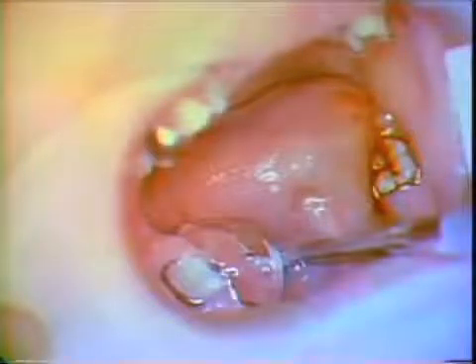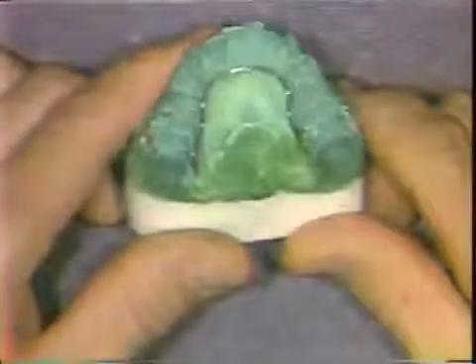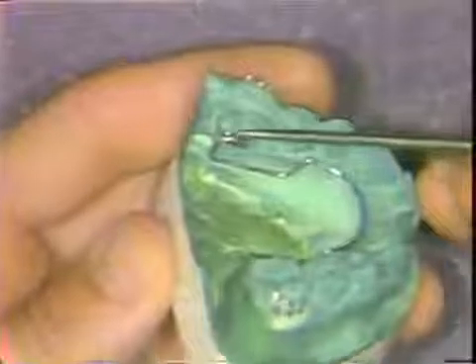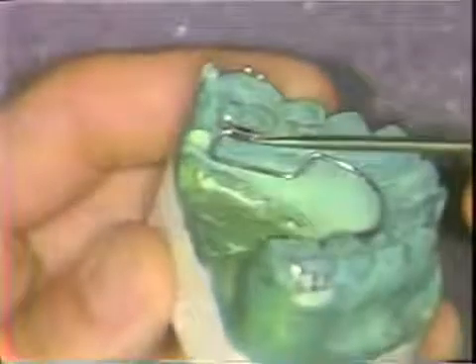In summing up the presentation of the horizontal lingual arch, let me just review for a moment the main features in that it occupies a narrow, thin portion along the lingual surface of the molar teeth.